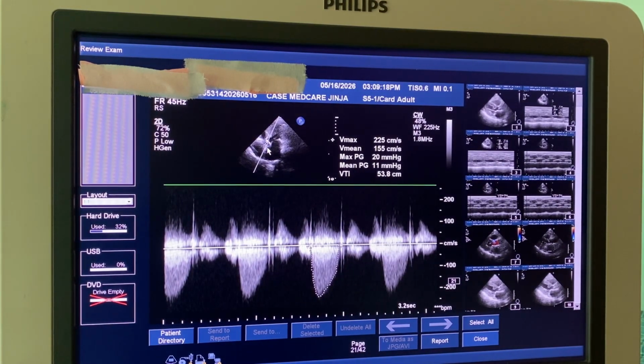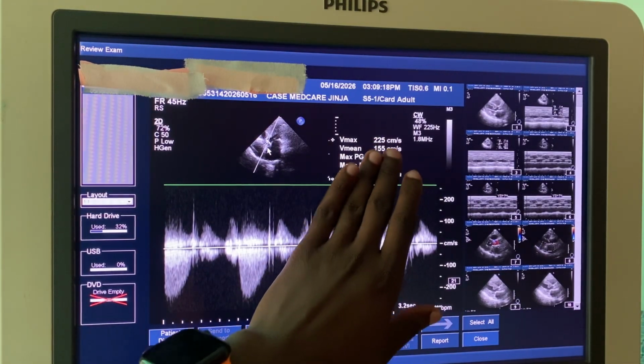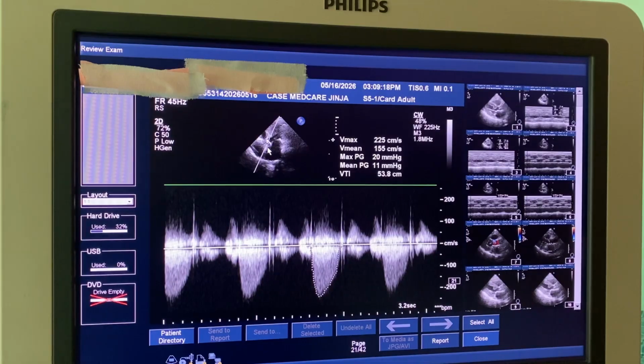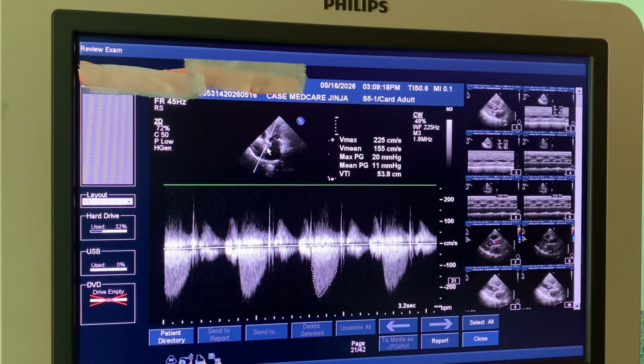But we saw by observation the valve was literally not opening. So there is no way these can agree. We have to confirm whether we are seeing poorly or these measurements are misleading. This means no single parameter should be used independently to grade.